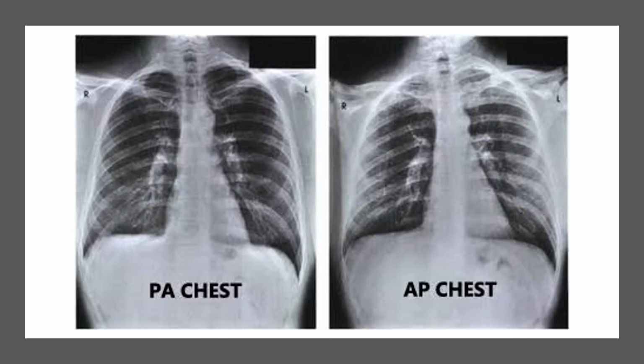All right, AP versus PA, and this is what I was talking about first. So AP, the first letter is the key thing to look at. The first letter is where the X-rays went through first. Did they go through the spine? Did they go from posterior to anterior, or did they go from anterior to posterior? So if you come into the ER and you see the radiology technician put the X-ray cassette behind a patient's back, then this was a portable. This went from anterior to posterior, because posterior is where that cassette was.